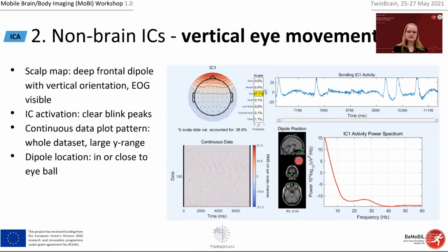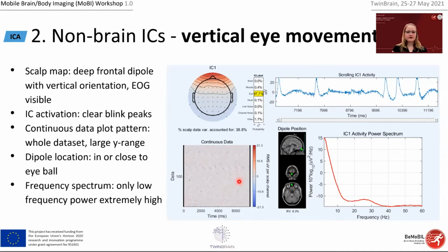So this is a dependency on the model that we use for the dipole fit. And what is very unique for eye components is that they have this huge power in the low frequency band. This is something that you're going to find in your data set, I'm pretty sure.